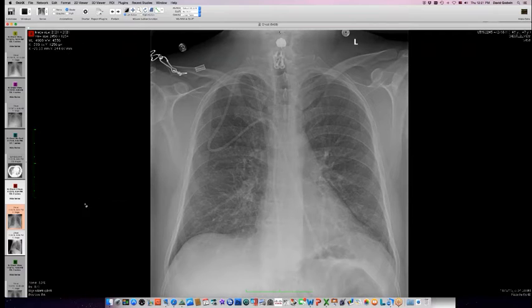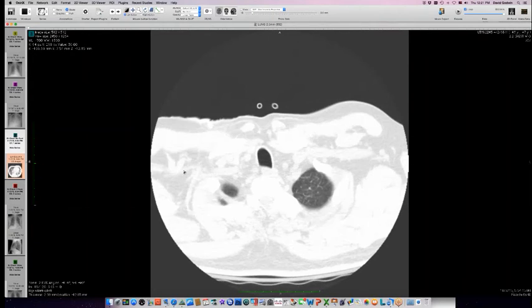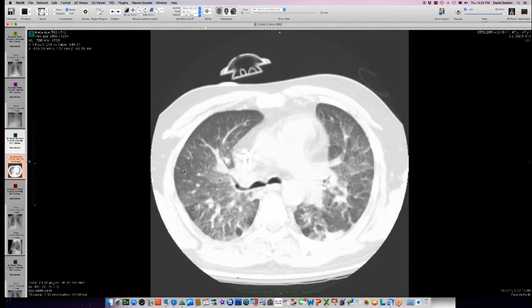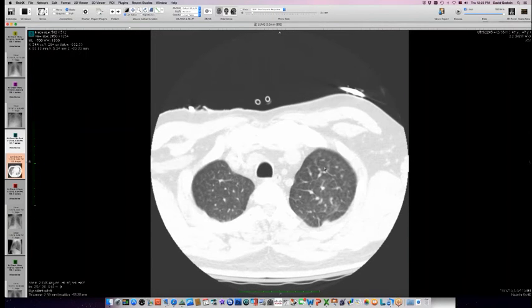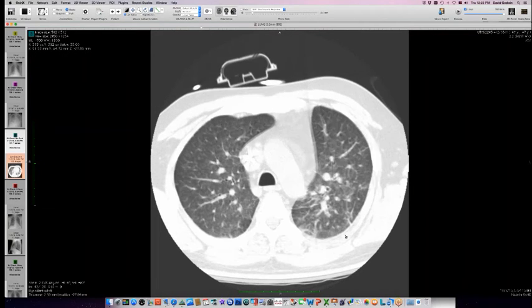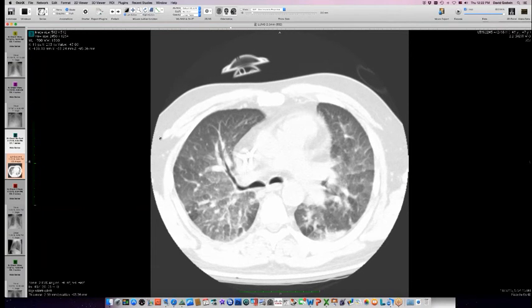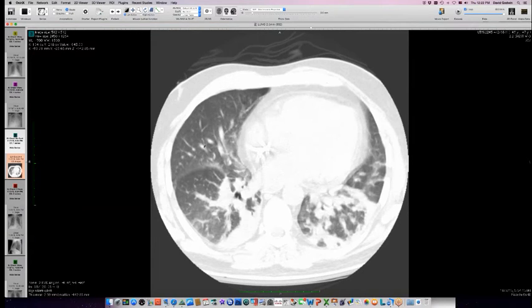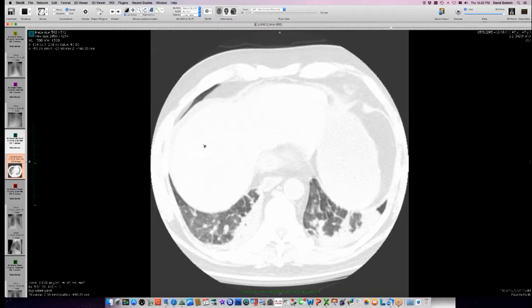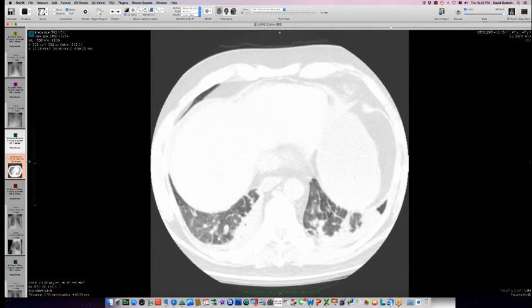But there was diffuse lung disease and some shortness of breath in this, and the person had this CT scan, which shows, as Howard was showing earlier, lots of septal lines. So we can see septal lines here in the apices. I'm sorry about all the motion artifact. And this sort of smudginess throughout the lungs, maybe some centrilobular opacities here and there, and then lots of atelectasis, and this coarse lung consolidation in the bases here. Again, lots of septal lines.